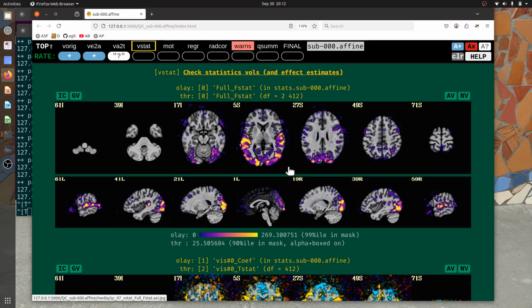That gives us a good sense of things like signal to noise ratio, maybe motion. We might see misalignment. But there's also just the fact that magnetic effects are complicated. More than just brain active regions will show effects, sometimes due to draining veins, breathing, heart rate, all sorts of effects like that.